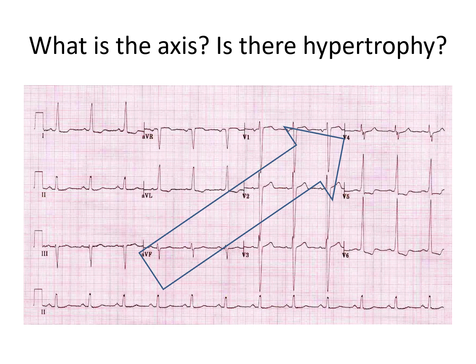If we look at 3D, in the precordial leads, we see a fairly usual picture of left dominance, which means that V5, V6 are strongly positive, and V1, V2 are strongly negative. So again, it's a left dominant heart in 2D and 3D with some left axis deviation.